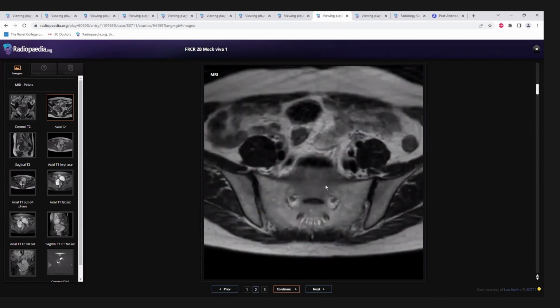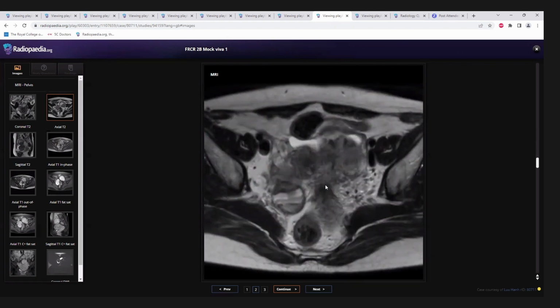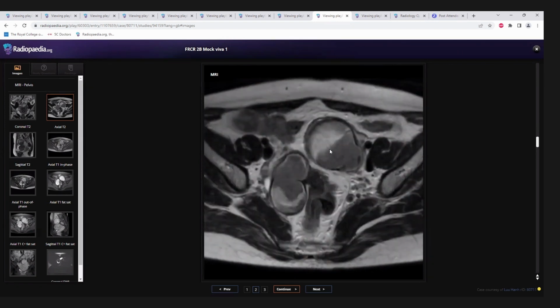Endometrioma. There are 2 signs which you have to say in the exam and even in your normal practice. T2 is very important for an endometrioma because you see 2 signs. One is T2 shading, that is because of blood products that layer. And secondly, a T2 dark spot.